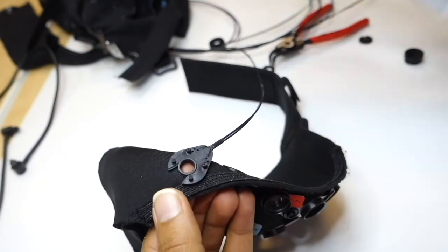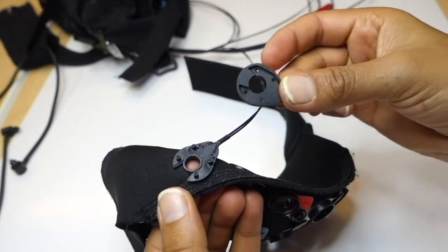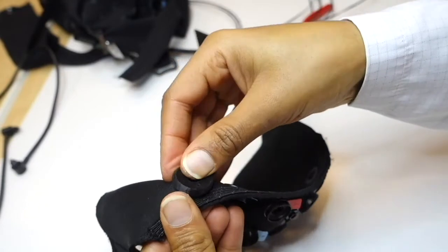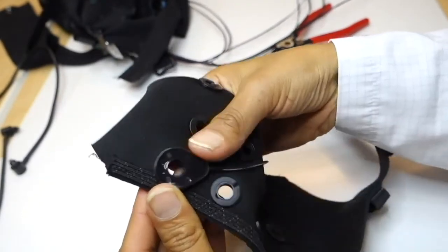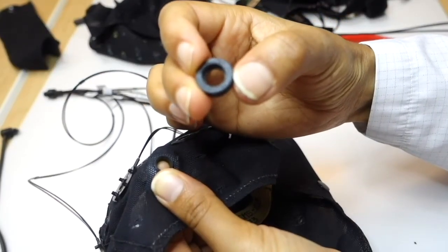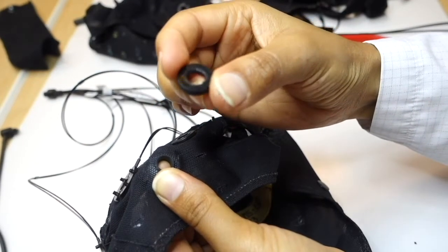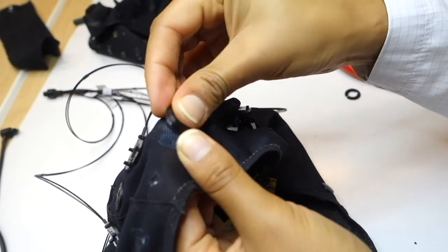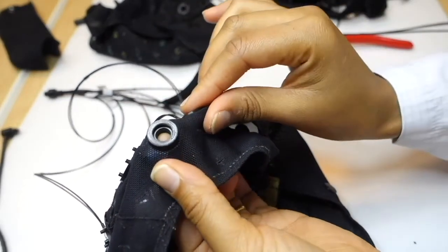And as you can see here, the rubber sleeve has grooves, and these grooves will fit perfectly into the detector clip. Simply place the rubber sleeve and press it gently, and that's it. Similar to the rubber sleeves for sources, the package also comes with rubber retaining rings for detectors. And simply, again, remove the standard retaining rings and place these as shown here. And that's it with the cap setup.